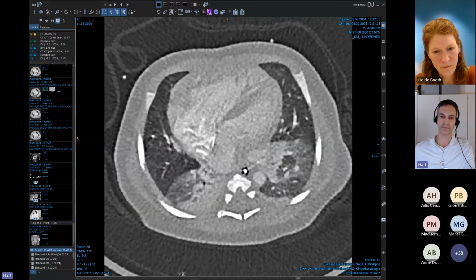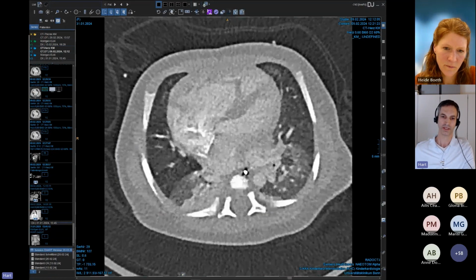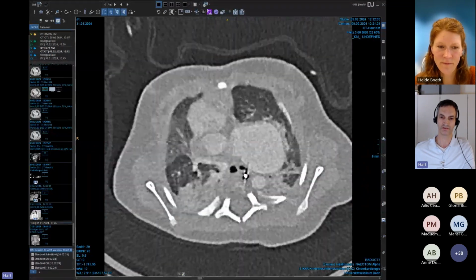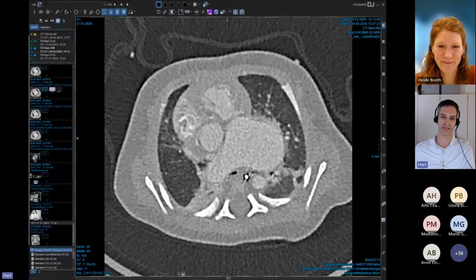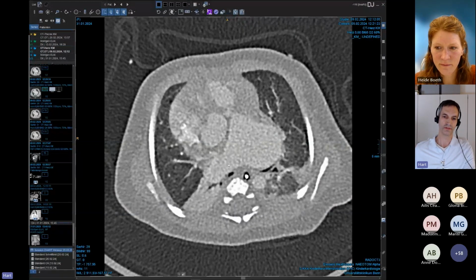In the basal lower parts of the lower lobes, we have this formation here in the lungs. And of course, the VSD, malalignment VSD, you remember it's an extreme form of tetralogy of Fallot. And afterwards, this is the aortic arch. And we have compression of airway, especially on the left side, but also on the right side, due to those tremendously enlarged pulmonary arteries.